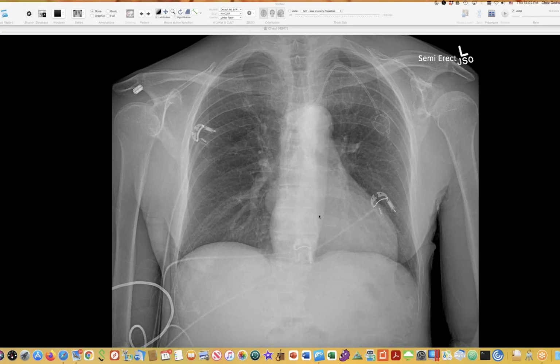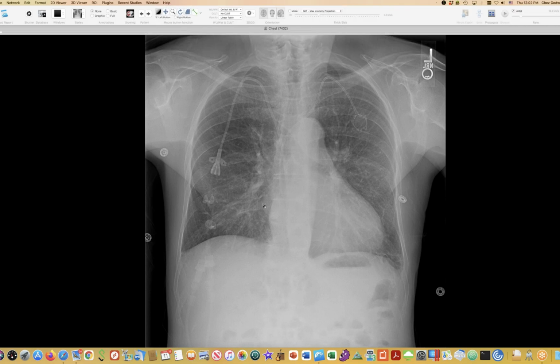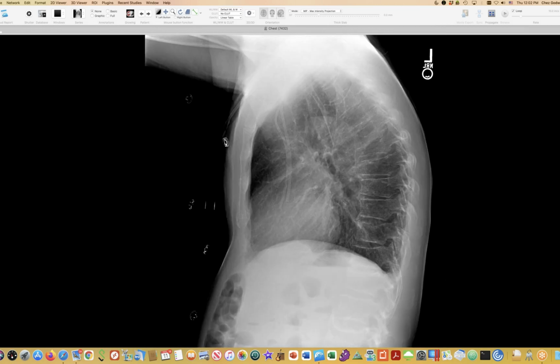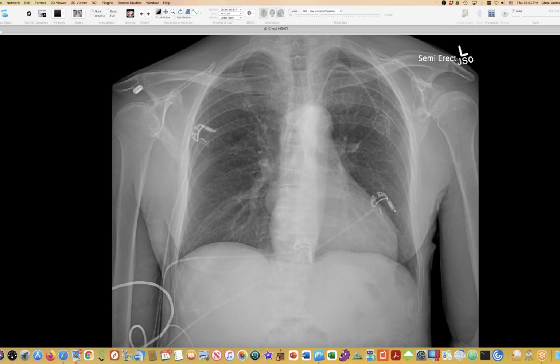All right, this person has an interesting radiograph with this smooth bump showing up. I don't have a lateral at this time, but on a different exam, the frontal view shows it as well, you can still see our bump. And on lateral view, this is what the bump looks like, which I can't find. So absence of bump on lateral, but it's definitely there on frontal. So anybody have any ideas what this smooth bump might be?